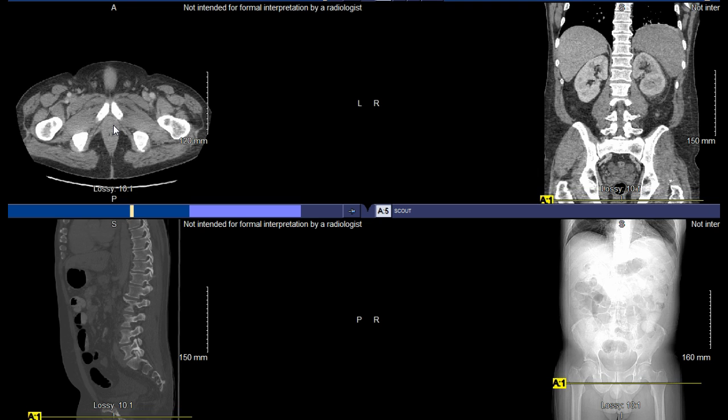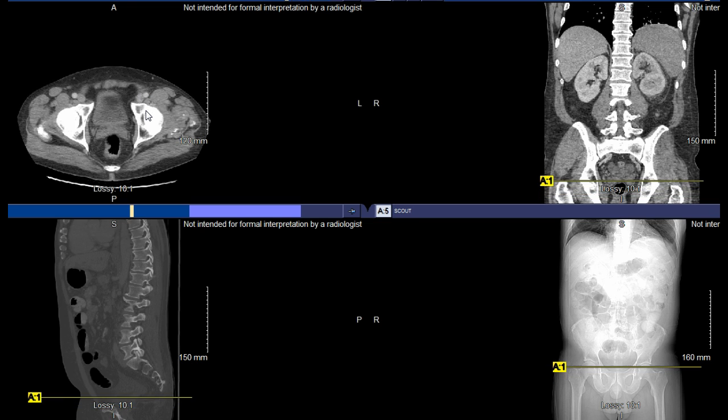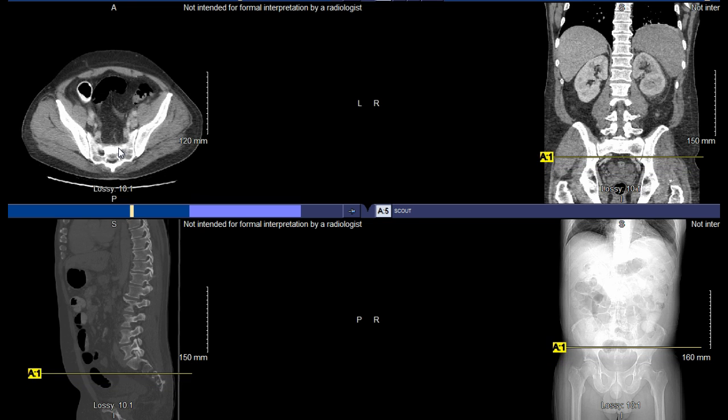Aside from those structures, you can see the origin of the penis here, so you can start to see the start of that. But aside from that, those are the structures that I'm really going to hold you accountable for going forward. In terms of the male anatomy, definitely be able to identify the prostate gland, seminal vesicles, urethra. Of course, the bladder, the rectum, understand their proximities and general locations in addition to some of those other basic structures there. If you have any questions about any of the male anatomy, be sure to let me know.